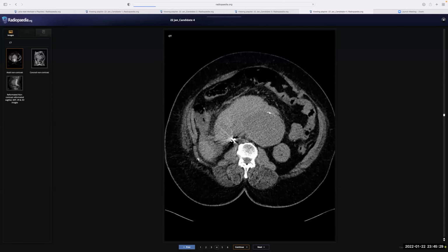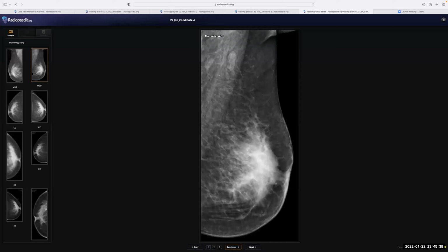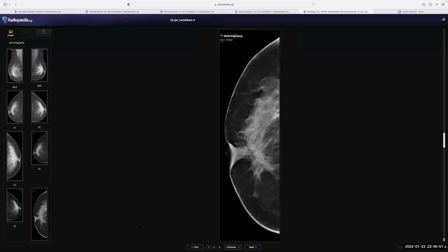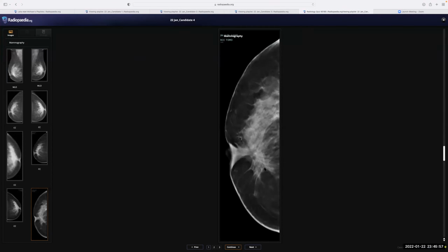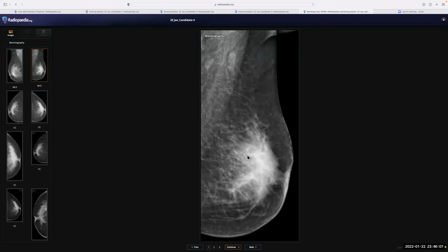Okay. Now for that case, this patient, they were screening for a primary. She had metastatic deposits elsewhere, and they were looking for the primary. Just for the initial look, you notice that there is asymmetry between both breasts. So there is an opacity here, and it's dense. And on the right side, when you looked at the tomography sequence, the tomography sequence confirms that there is an opacity here that is causing architectural distortion. So this patient is having bilateral abnormality in the breasts. Okay. This is one, and the second is here. Okay. Yes. Architectural distortion, asymmetry, and increased density in both breasts.